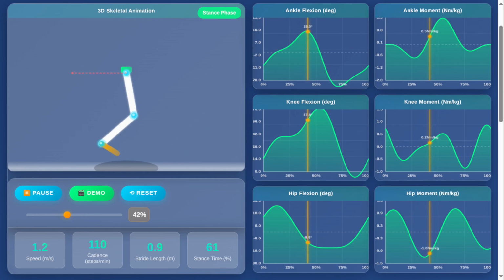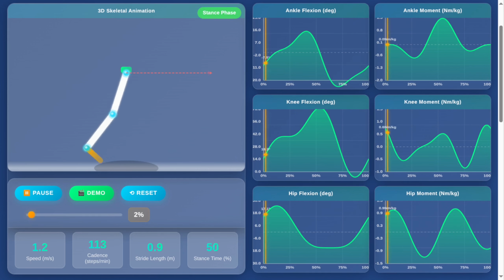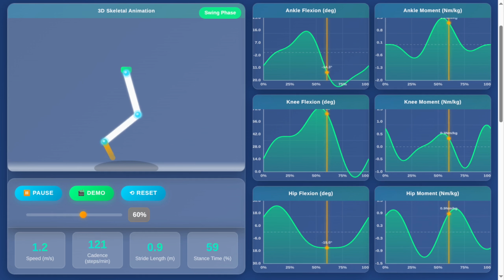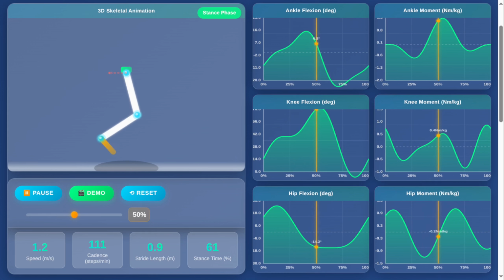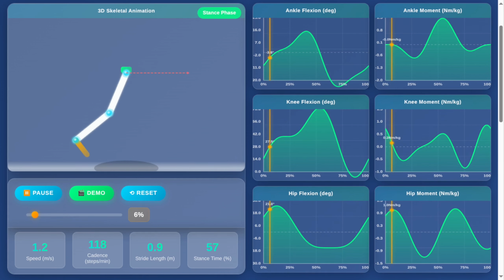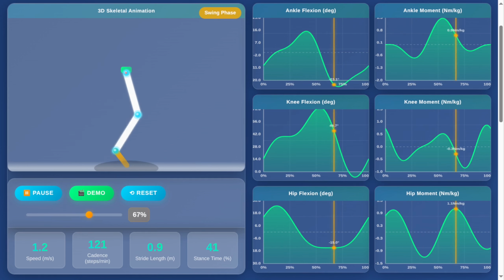All right, let's look at the ankle. It appears that the ankle itself, specifically the foot, is not depicted as touching the ground throughout the animation. Instead, there's a small, flat gray oval beneath the lowest point of the leg that represents the ground contact. So while the leg is clearly moving through a gait cycle with ground contact indicated, the actual skeletal animation doesn't show the physical foot making contact.